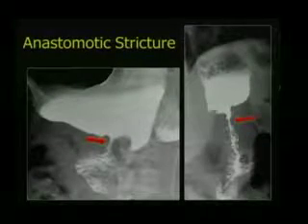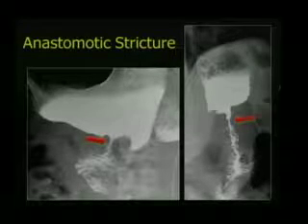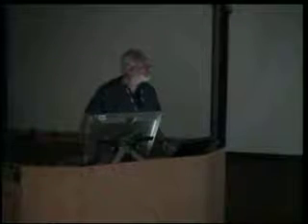Okay, and I have other cases. These are two. Was that a recurrence? No, it was not recurrence. What was the nodule? It was benign, but I don't remember the reason for the surgery. Did you have endoscopy? This patient, I don't recall. But this is important, because you see a tube, you see a mass growing into the lumen.